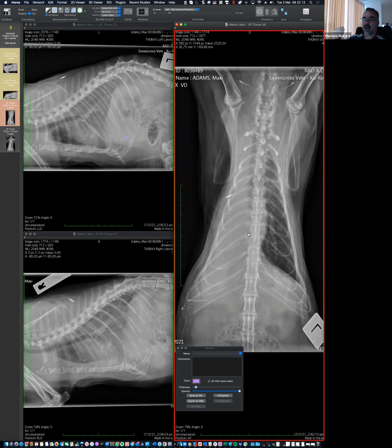Now the interpretation of that, there are multiple ways to interpret this. One was all pleural effusion. We talked about that, and to summarize why I think that's unlikely, there's no mass effect, and we don't see any hint of the border of the lung. So then the second hypothesis, I like the second hypothesis being, well, there is something in that lung that turned all those right lung lobes into soft tissue. And probably the disease process kept those lung lobes with the same overall volume, and that's why there is no mass effect. Any other hypothesis?